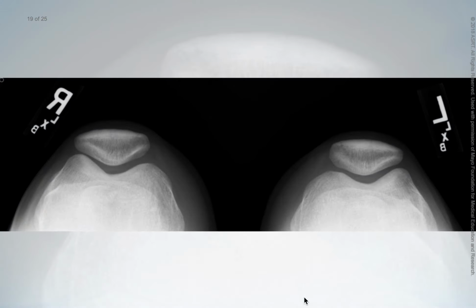A tangential patella projection will demonstrate subluxation or fractures of the patella. It also is used to evaluate the patellofemoral joint and the femoral condyles. When the Merchant method is used, both patellae are included on the image and are slightly magnified.